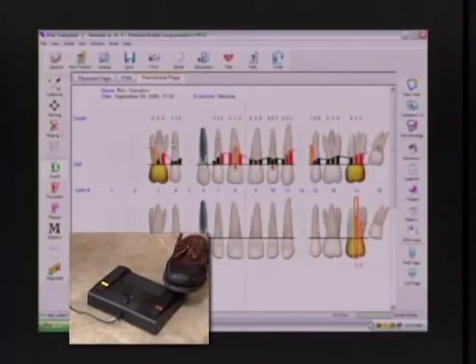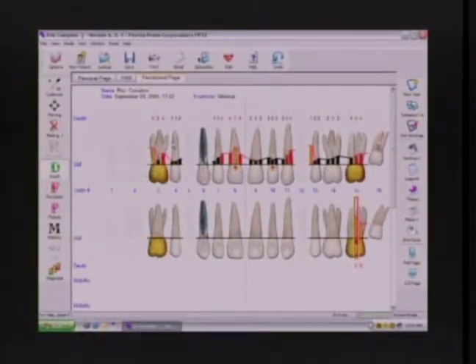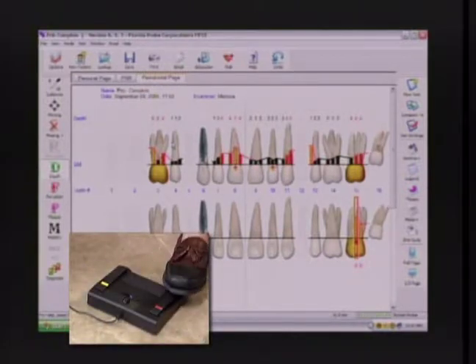So what did quick taps on the red pedal do? Recorded bleeding, on and off as a toggle. Remember, there's 2 strokes. Quick taps, hold and listen. Quick taps recorded bleeding, but hold and listen puts me into a moving mode. You are in the moving mode.